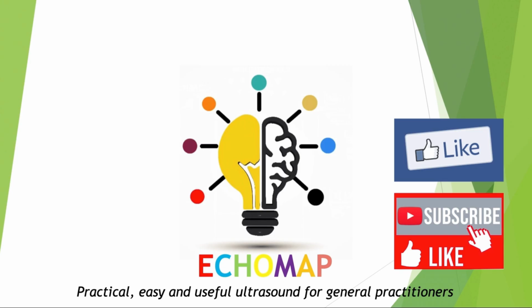And today, indeed, we're going to talk about something that's tricky in practice, especially when you're just starting out, and that can lead to a lot of doubts and confusion. And yet, it's easy if you master it and understand it. Specifically, the principle behind artifacts.